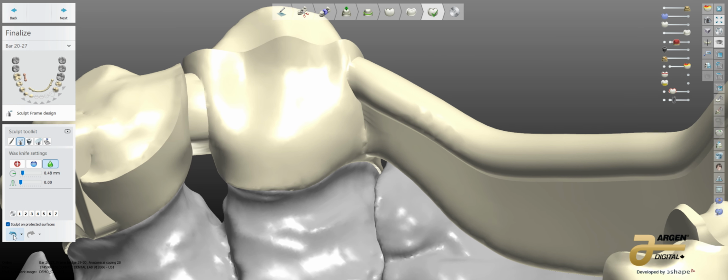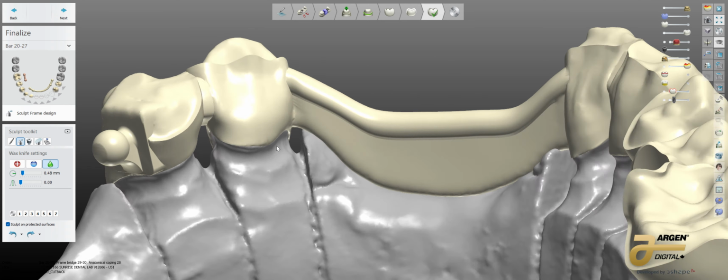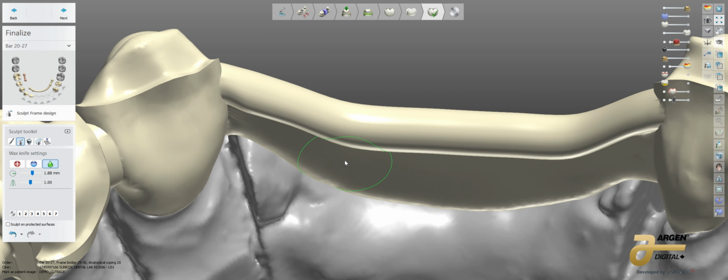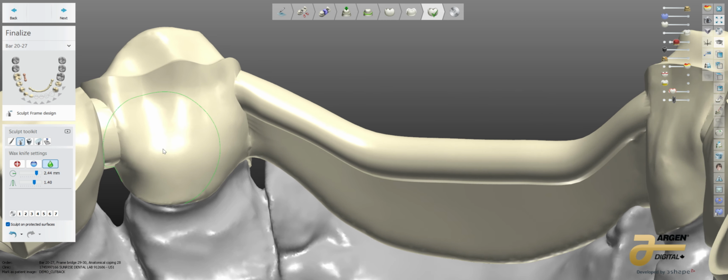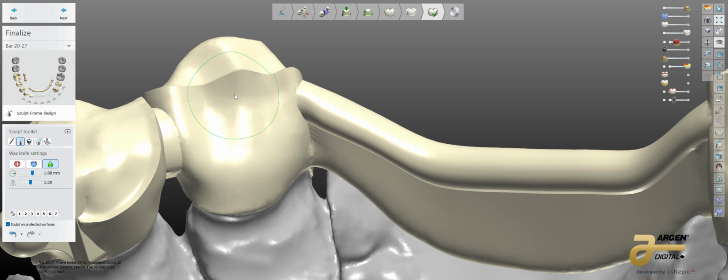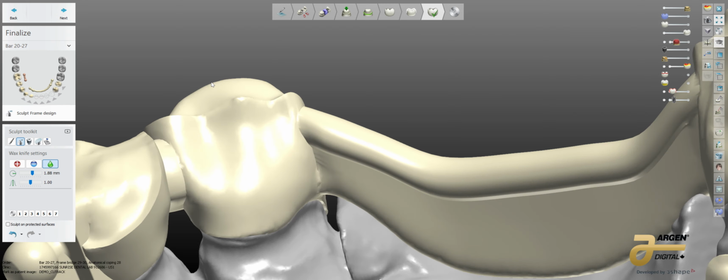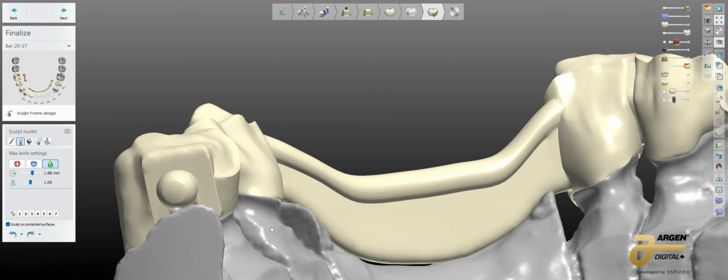Actually, no, I have it just the opposite. Fun thing about live things. So let's go ahead and turn this off. All right. Now let's see what's going to happen. Oh, I'm going to just kill it, right? So on the connectors itself, it's more or less on this area here. So see how I can degrade that aspect of it? Turn that off, then I can't degrade this area. I can only degrade the area that's below the margin line, right? You guys all know that. I shouldn't have to tell you that stuff.